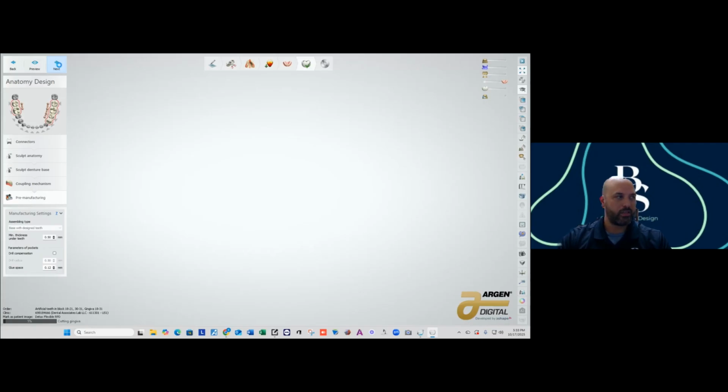You'll notice the settings that I've got here, I use those settings. I actually created the material file for this. So those are the settings I use to produce these. And you'll get some pretty good results from them.